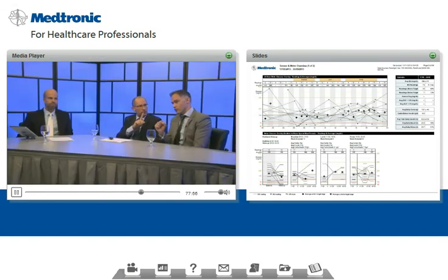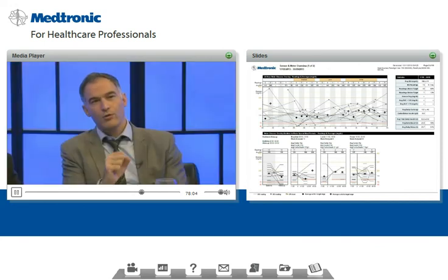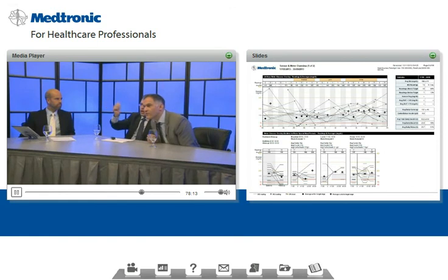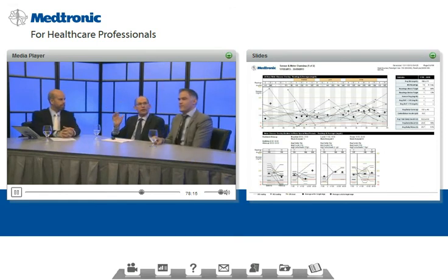Can you stop for a second here? Sure. Can we have an answer to the question, is it a carb counting issue or is it a bolus issue? Only partially through an output. Right. All we can know is what they enter by way of carbs. If he said he had 60 grams of carbs for that meal. The average daily carbohydrate intake is 153. Yeah, so either he's intentionally having lower than average daily carb intake.